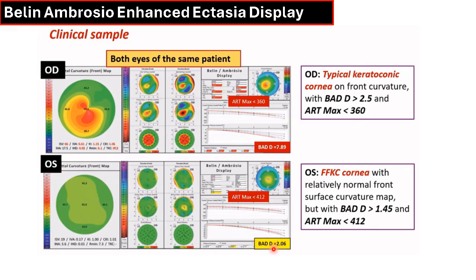Because as you know, keratoconus is a bilateral disease, but very asymmetric. Sometimes you find one eye with severe keratoconus and the other eye is very mild. So the advice is always look at both eyes. Don't diagnose just a single eye. If your patient came with this eye, you have to look at the other eye. Or if the patient came to you complaining of this eye, you should look at the other eye. The other thing is that keratoconus is very asymmetric. Sometimes you'll find one eye with keratoconus and the other eye is completely normal, but this doesn't mean that it is fit for keratorefractive surgery, as this might be a form fruste keratoconus.